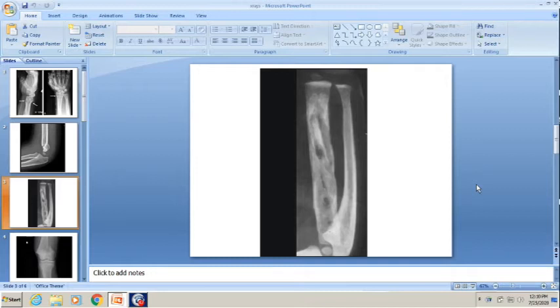So possibly, what is this underlying disease? Sir, osteomyelitis. Chronic osteomyelitis. You have to mention that you don't get something like this in acute osteomyelitis. In orthopedics, if you are shown something like this in an X-ray and you think of osteomyelitis, you should say it's chronic osteomyelitis. Okay, so it's a chronic osteomyelitis of the radius.